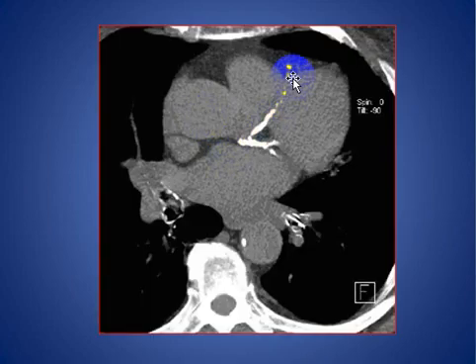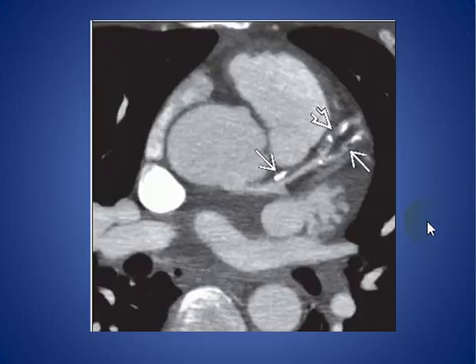Here there is calcification of the circumflex artery and the left anterior descending artery. Extensive calcification. Also incidentally, there is calcification of the left and right main bronchus and dot calcification of the descending aorta.